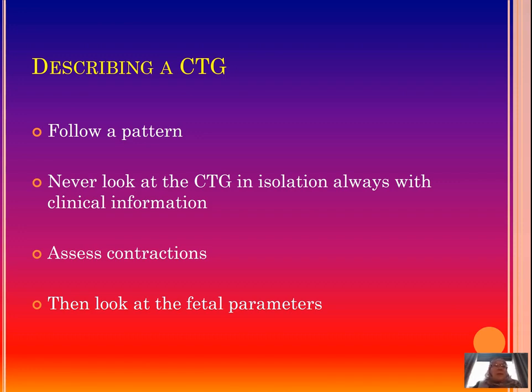You have to assess contractions. I've already said that. And after you've assessed the contractions, you then look at all the fetal parameters that we have just discussed, and we'll go through all of them one by one in the following of this presentation.